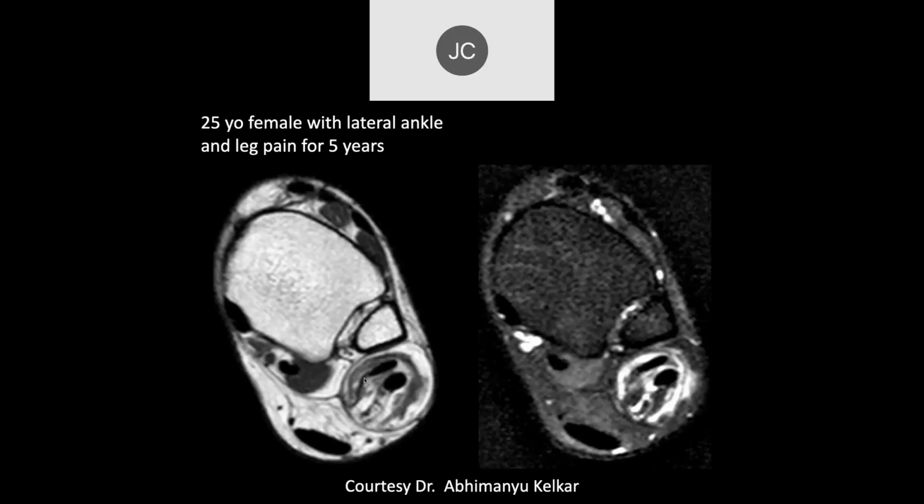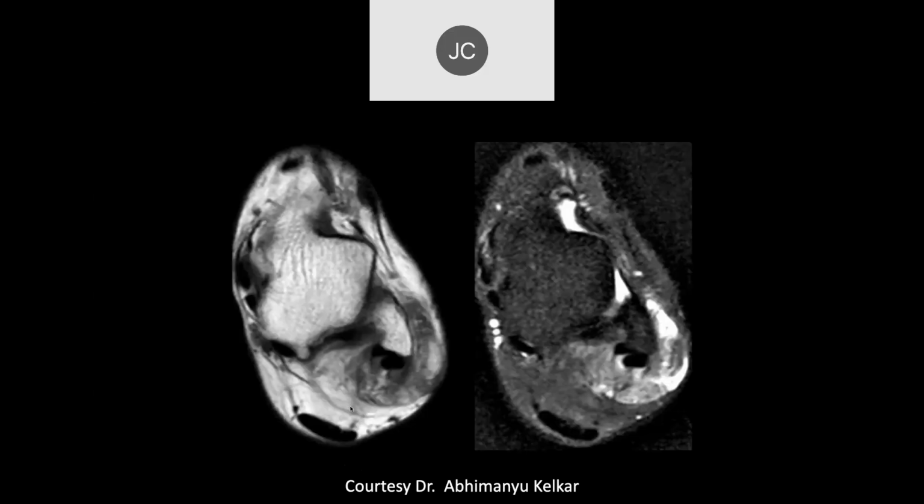Is that a peroneus quartus? I'm sorry, what? Is it a peroneus quartus muscle? No. Is that the myotendinous junction? No, that's not, I'm blocking on the name of it now. It's basically an attachment, often has vessels in it that goes to the tendons and is a connection between the tendons and the synovium. And I'll think of the name in a minute.